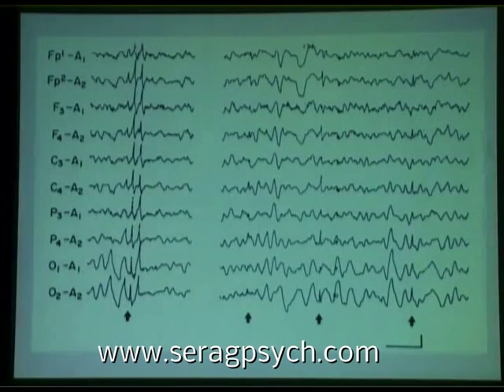Next, please. And I showed you also these bursts of sobbing that look like spike waves. Why are they not spike waves? Because their field is far more widespread. Notice that. A spike wave wouldn't go all the way from the left and right occipital region all the way to the frontal polar. That just can't be.